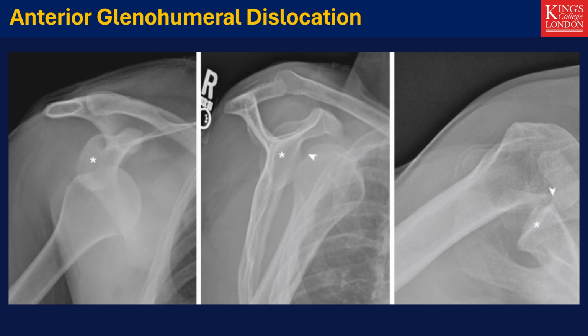The axillary view, when obtainable, demonstrates anterior translation relative to the glenoid face and removes diagnostic ambiguity. Always evaluate for associated injuries. Look specifically for a Hill-Sachs impaction defect of the posterolateral humeral head and a bony Bankart fracture of the anterior inferior glenoid rim. Anterior instability follows a recognizable pattern. Train yourself to identify it immediately.